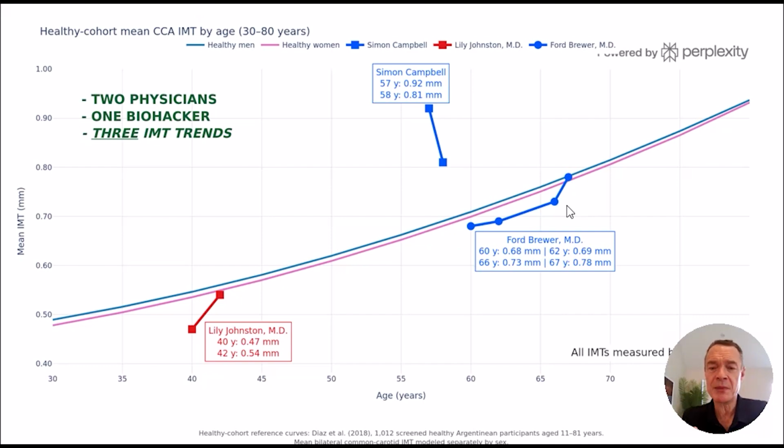He's correlating intima-media thickness, the regression he saw once 11 years ago, with plaque, and that's not the same thing at all. Intima-media thickness is the mean up and down the highway, which may include plaque lesions or not.